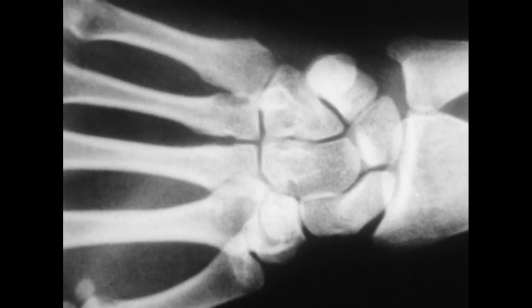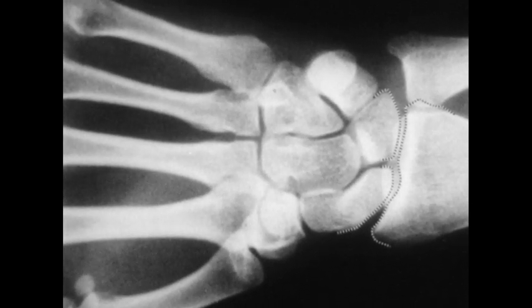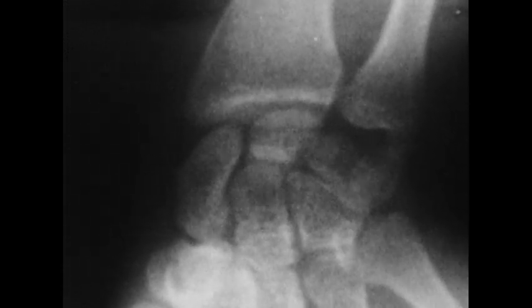The distal end of the radius and its articular cartilage provide a smooth concave surface for articulation with the carpal bones. Radiocarpal joint movements are free. The multiple articulations allow all angular movements, including circumduction. Abduction and adduction are restricted by the bony radial and ulnar styloid processes and the strong ligamentous bindings.